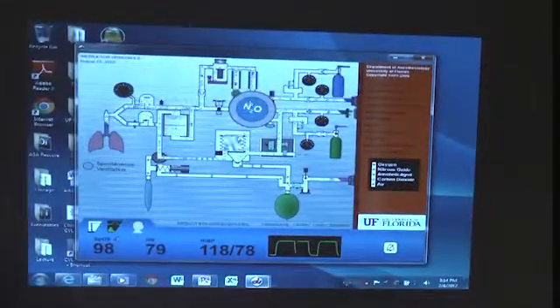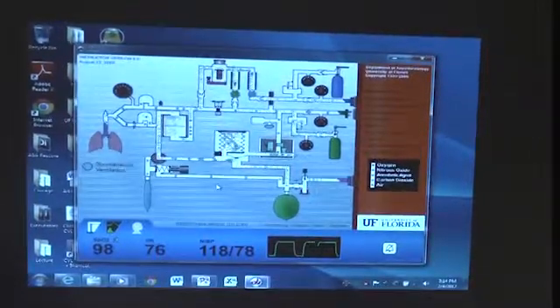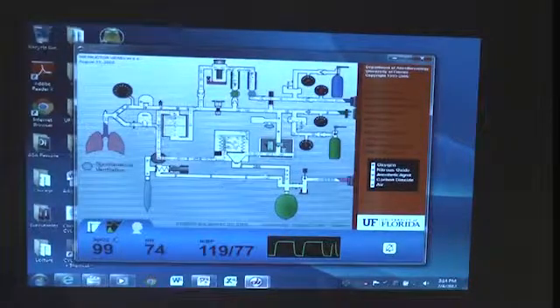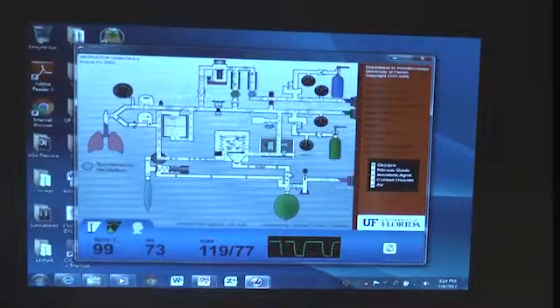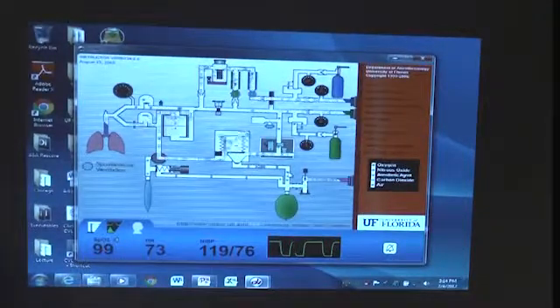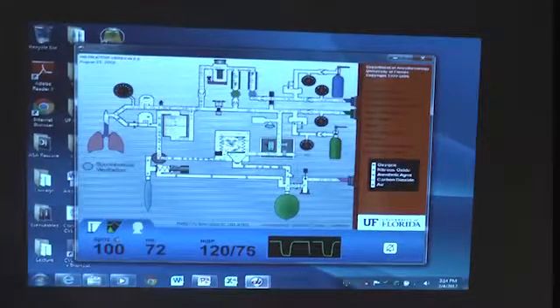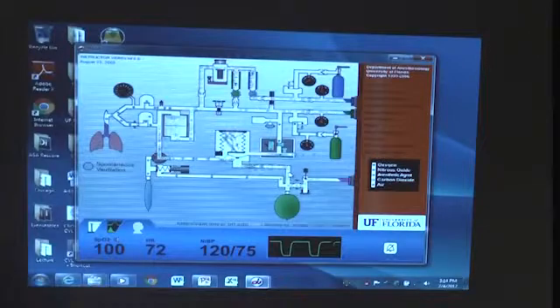And that's done through a chain link. And the chain link assumes that what is in the oxygen pipeline is always oxygen. So here clearly, what is in the pipeline is not oxygen, right? But the chain link doesn't know that. So it's not really a hypoxic guard. It's letting a hypoxic anesthetic mixture be delivered.